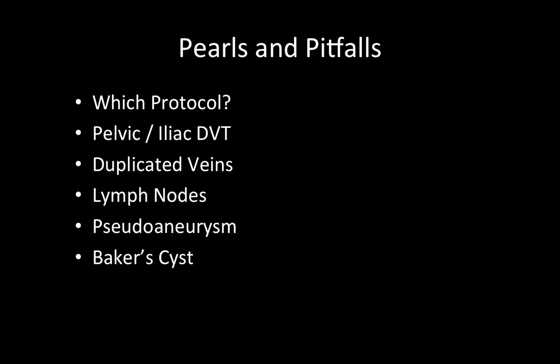Finally, we'll review some pearls and pitfalls of this diagnostic procedure. We talked about the two-point protocol. This is what we use at bedside in the emergency department. You will see when radiology does a study, they often do a complete leg protocol. Where is the DVT? We can only evaluate the femoral, popliteal, and some of the calf regions by ultrasound. We miss iliac DVTs as well as pelvic DVTs with this modality.